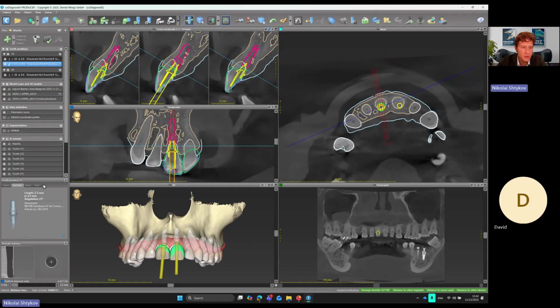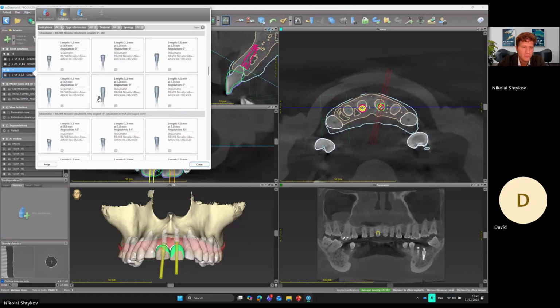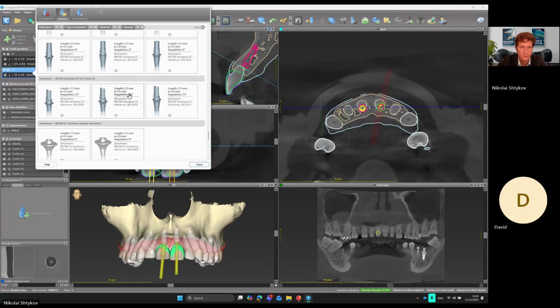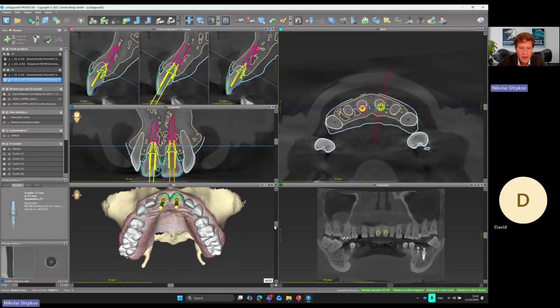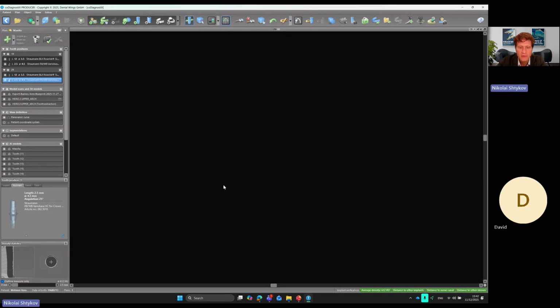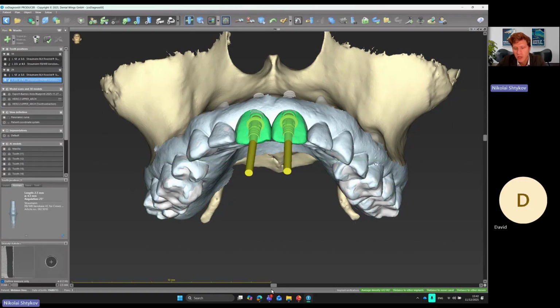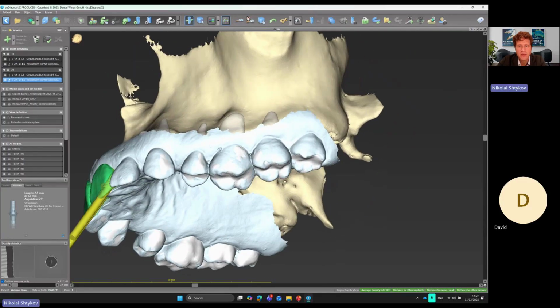Then click on close and select another one. So, and now I can see the dataset alignment. So let's maybe switch off this model and just keep our STL here.